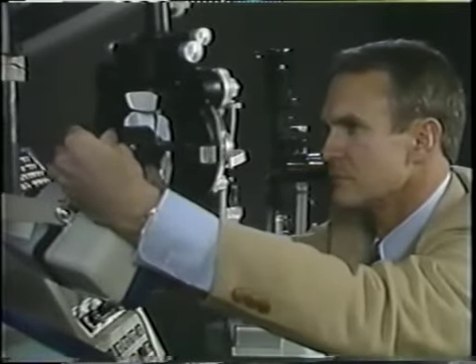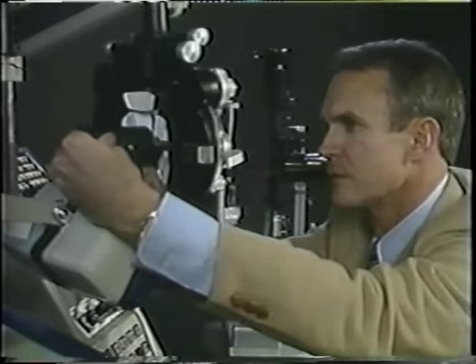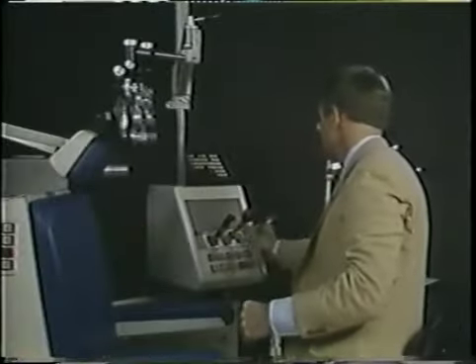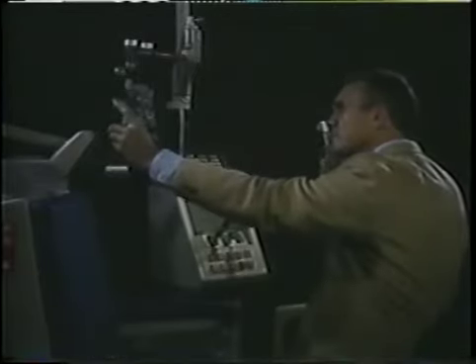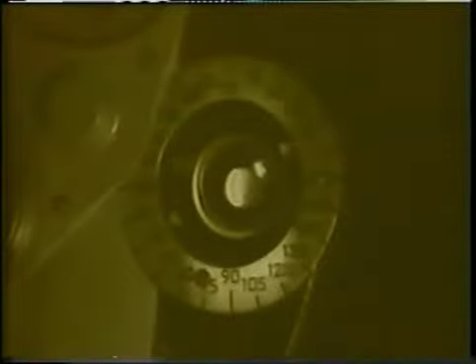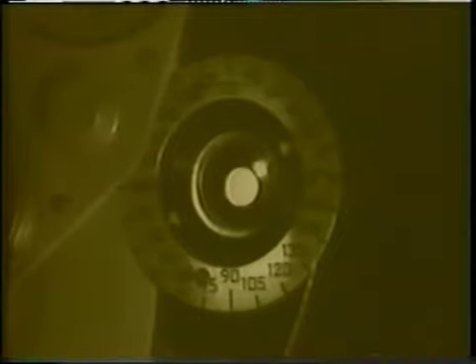Now it's time to retinoscope an eye with an unknown spherical error. First, set the schematic eye to an unknown spherical value without looking at the scale. Then position yourself at the normal working distance and dim the lights. Be sure to hold the sleeve on the retinoscope up and look for with or against movement. Here's with movement. That's easy. We dial down to add plus until just a little with movement remains. That's too far. Back one, and we're done.